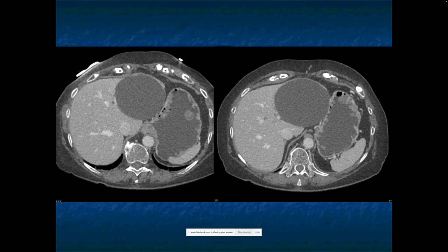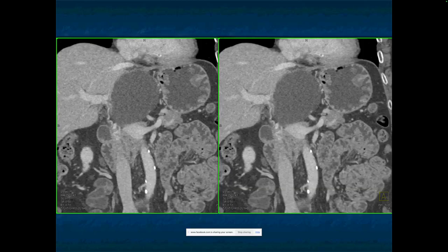As opposed to the last case, these aren't vascular, and in fact, they're relatively low density. If I was thinking about polyposis syndromes, they're more solid. This is low density. That's more common in polyposis or just polyps in the stomach that are benign. You're going to have multiple adenomas. You obviously will end up biopsying this just to make certain it's nothing of concern. But there they are, multiple polyps, particularly nicely shown greater curvature on these images.